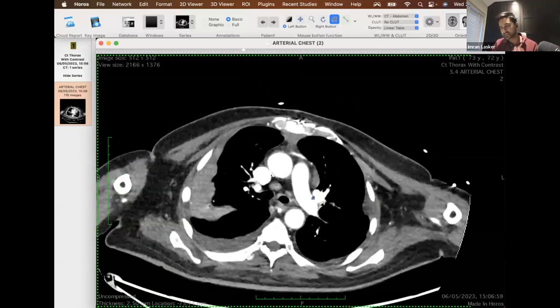So if I go to this particular slice, is there anything that makes you particularly concerned about what's happening here? If you do find anything that you'd be concerned about, then do throw it in. If not, don't worry. I'm going to quickly talk about something else in the meantime.